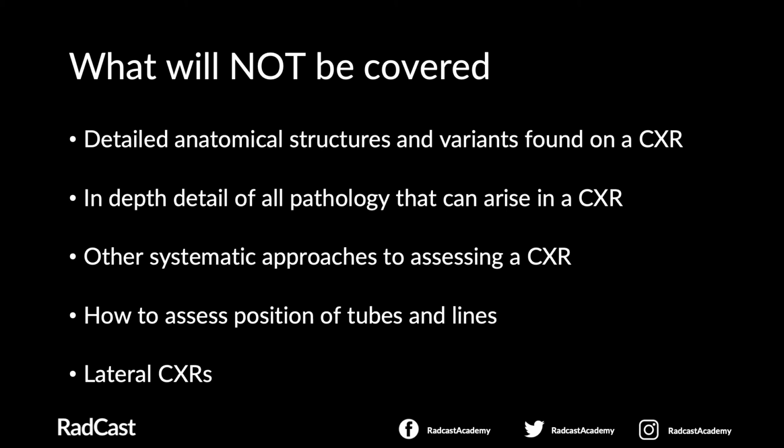We will not be discussing or showing you how to assess the positions of tubes and lines on a chest X-ray, as this is beyond the scope of this presentation, and lateral chest X-rays. All the images presented in this presentation will be through the use of frontal chest radiographs.